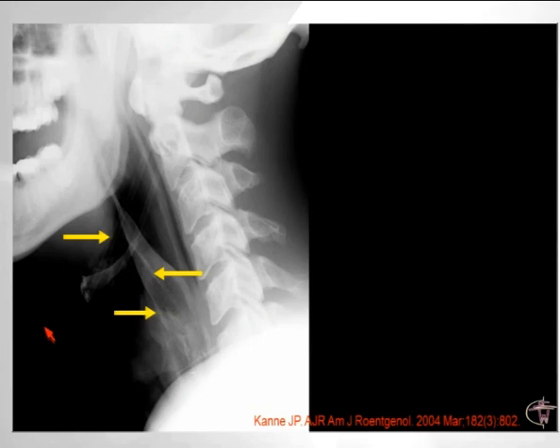And you can see the soft tissue attenuation in his pharynx with the bones of the fish in the middle, and unfortunately the spiky bones in the dorsal fin of the fish had pierced his pharynx and had caused retropharyngeal soft tissue emphysema, which was confirmed at surgery when they removed the fish.